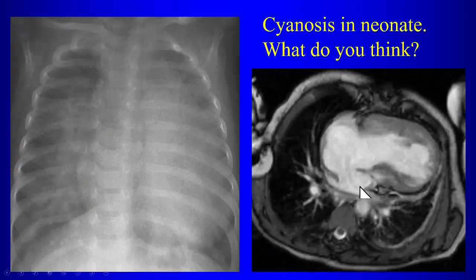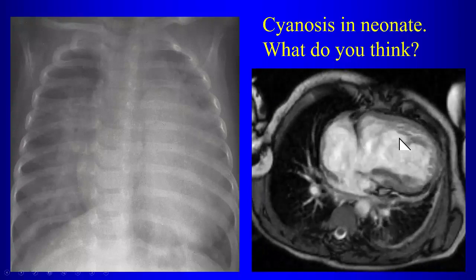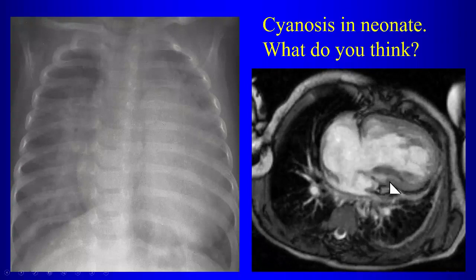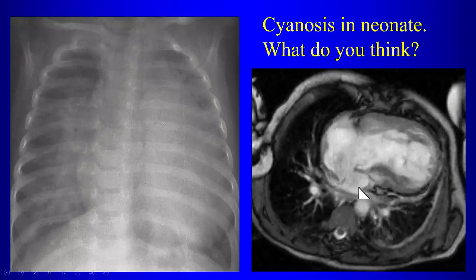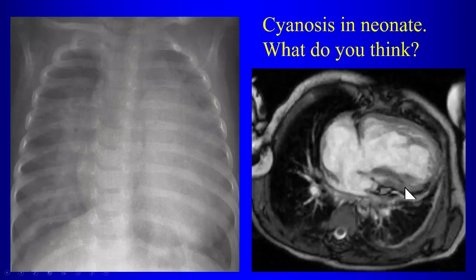Now, left ventricle. You said single ventricle. Is this chamber emptying into that? Is the left atrium emptying into that chamber? No, right? It seems to be emptying into what? Hypoplastic, yeah. So this is a very small left ventricle. Also, the left atrium is small, right? So this condition is called hypoplastic left heart. Right? So although it's hypoplastic left heart syndrome, right?